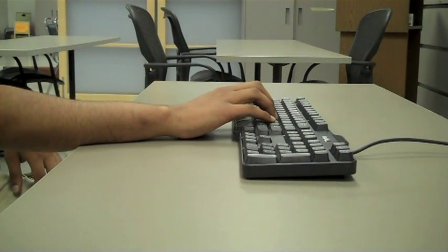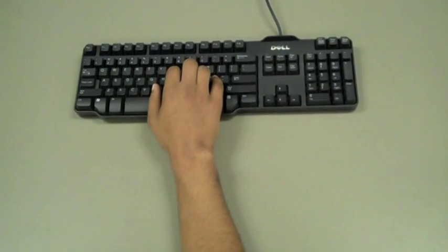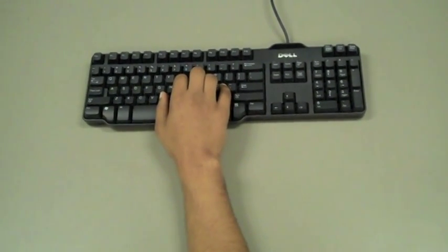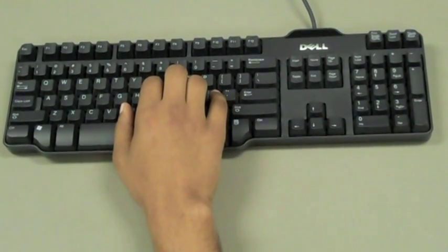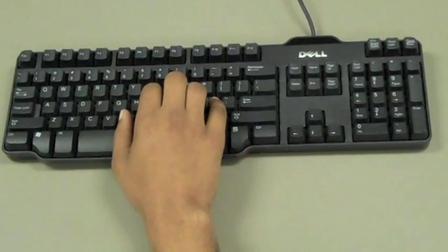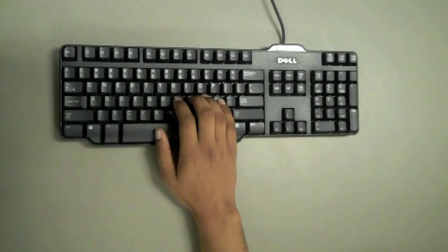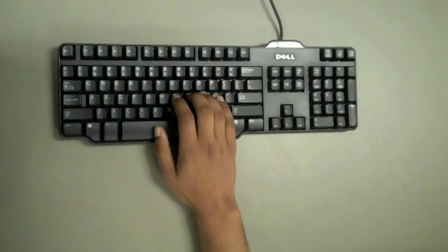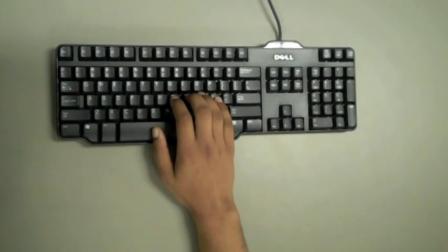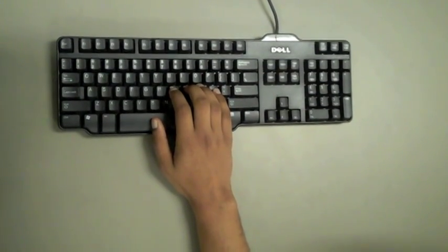In the standard keyboard, you can notice there is wrist extension because the keyboard is elevated from the table. Now you can see when the participant's hands are in the typing position. The wrist is ulnarly deviated, forearm is in pronation, and the fingers are flexed. In order to use the standard keyboard, the starting position requires pronation of the forearm, wrist extension, finger flexion, and ulnar deviation at the wrist. Wrist extension can be minimized by using the hand rest.